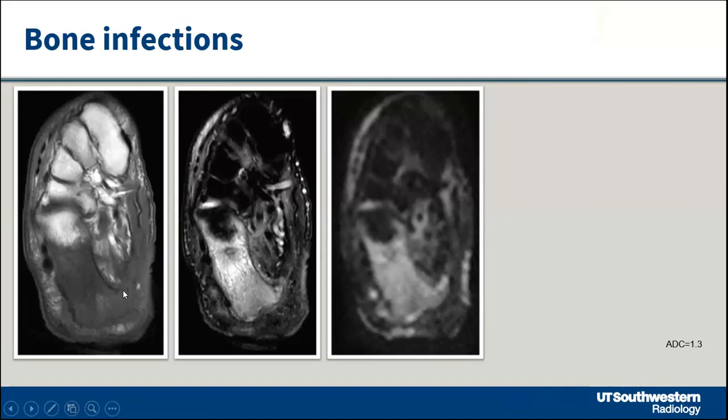So this is gone. Look at on T2 images, this black line gone away from there. So this black line is preserved. So that's where the erosion has happened. And look at on diffusion when it's just reactive edema versus more of the osteo. More of the osteo will have brighter signal. Reactive edema is less bright.